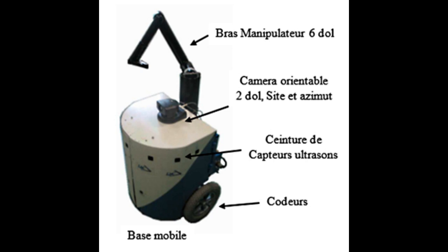Assistance for People with Motor Disabilities, ARPH. Robotic assistance for the disabled aims to replace motor functions lost by the person, essentially mobility and manipulation.